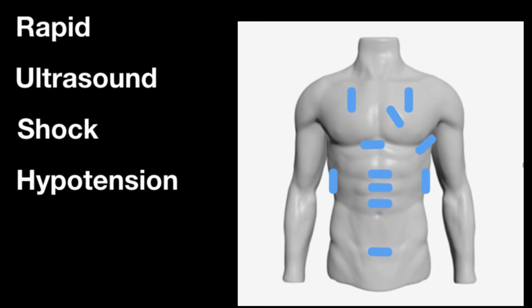As you have suspected by now, RUSH is an acronym standing for Rapid Ultrasound for Shock and Hypotension. It is a structured protocol for point-of-care ultrasound performed at the bedside of a patient presenting in shock with unknown etiology. It looks a lot like the FAST or EFAST exam performed in traumatically injured shock patients, but is slightly longer and more detailed with aims to differentiate between hypovolemic, cardiogenic, obstructive, or distributive shock in the medical shock patient.